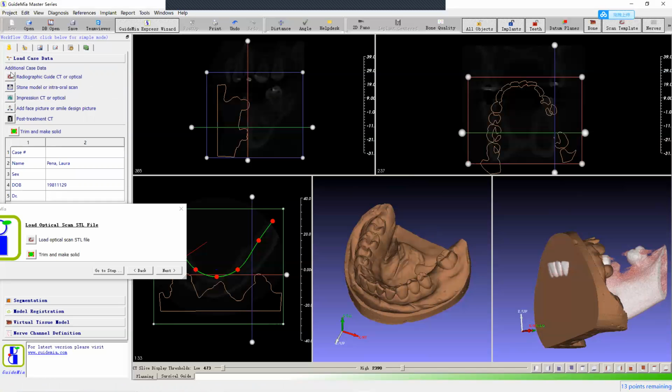So those things are supported with our system. In other words, any means you can use to contain the anatomic information, you can scan them and align them together. So that's what I want to say.